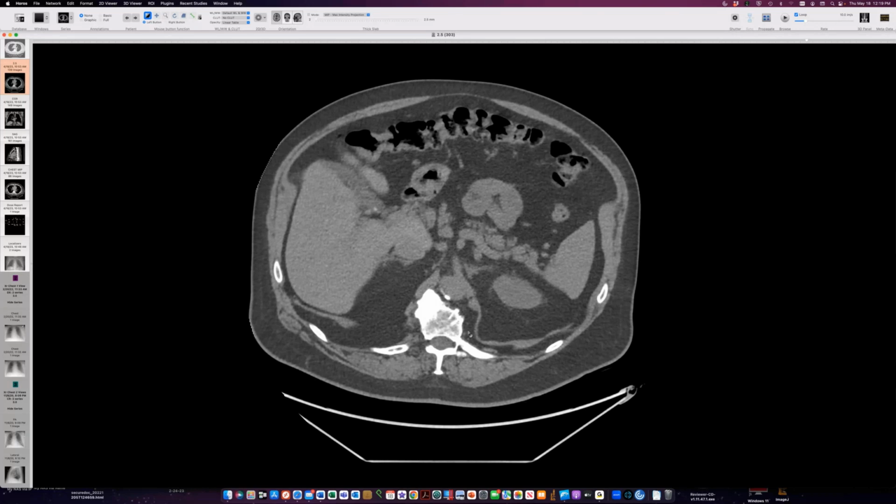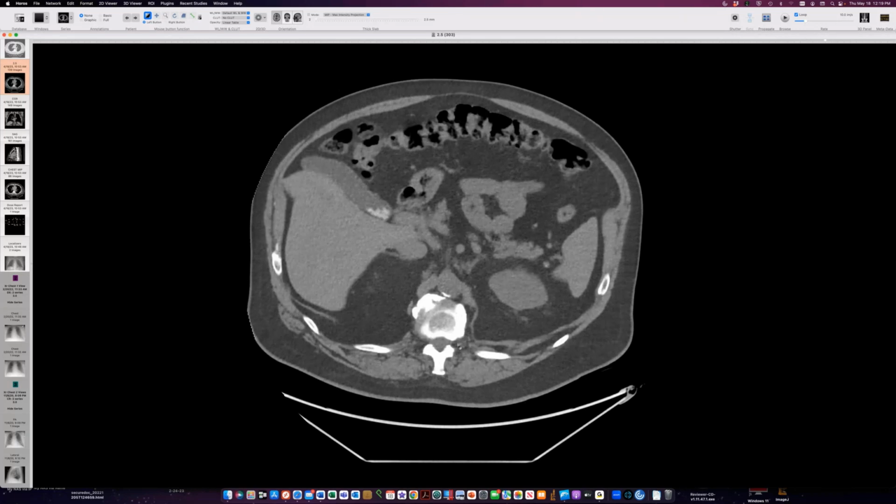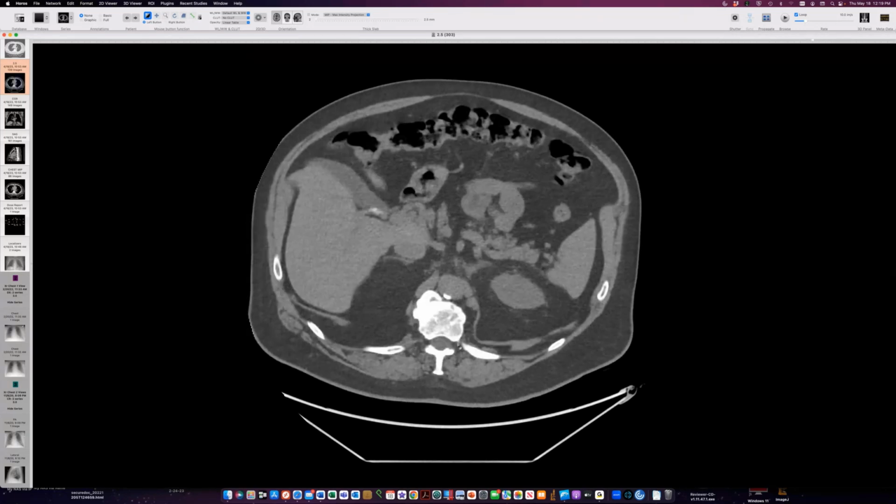Okay, yeah, I agree though. Yeah, we see them more and more, and with larger patients too. I think we see them more frequently, right. I mean, to the point where I ignore them unless they're really big and causing problems, because it's like a normal variant of aging. Yeah. Okay, so there's some susceptibility back here. I don't think it has a name on it, but there's some weak area obviously that gives way in a fairly consistent way in these people.